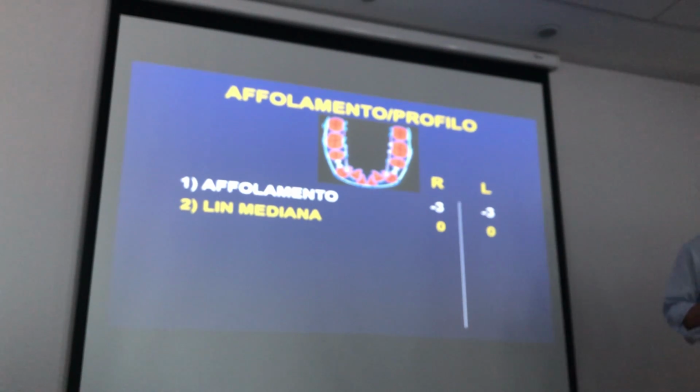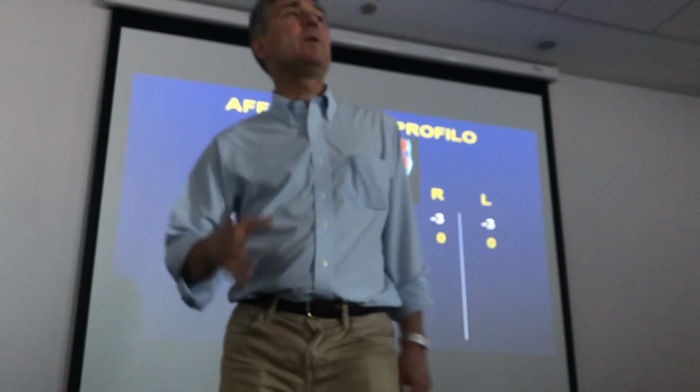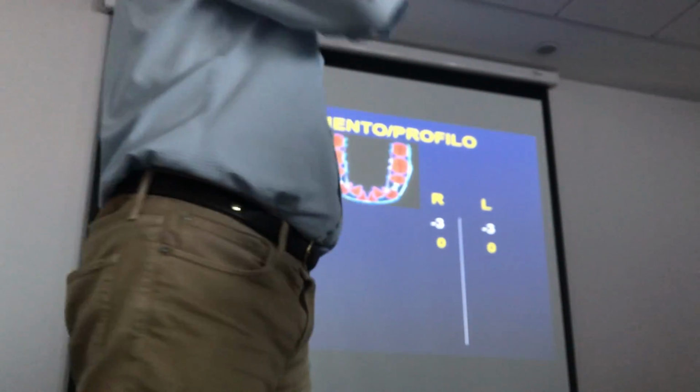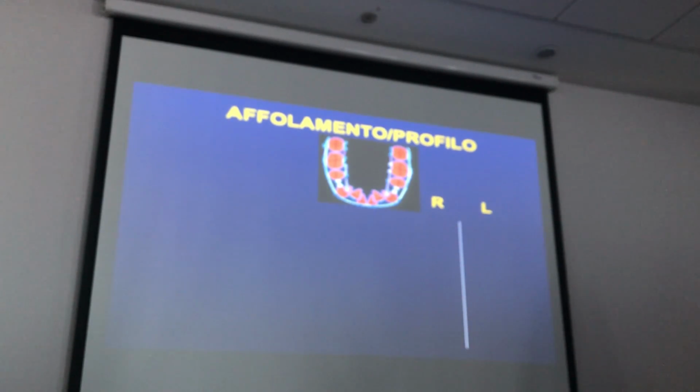Let's see how is the profile. Profile is indicated by the lower incisors. Why do we consider the lower incisor to indicate the profile? Let's go back a little bit and I'm going to show you.